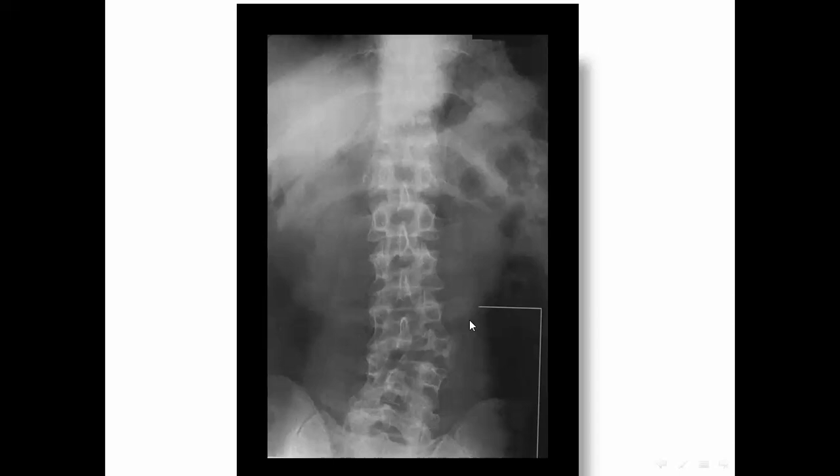So tracheoesophageal, renal, anal, and vertebral constitute an entity with usual associations. If you find renal anomalies, search for vertebral. If you find vertebral, search for renal, anal, and tracheoesophageal. In this case, you find a soft tissue tumefaction here crossing the upper abdomen. So, going back to our principle, vertebral anomalies are usually associated with either tracheoesophageal in young, or renal in older age, or anorectal in the young.